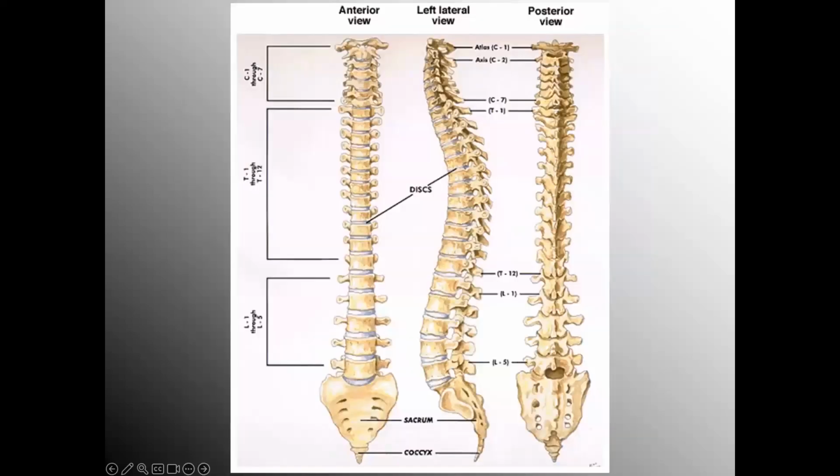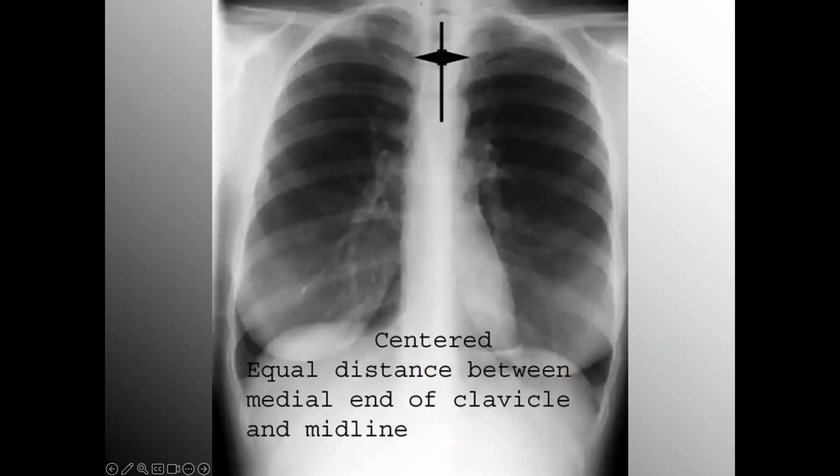Note that the thoracic spine begins, of course, with vertebra number 1, T1, but T1 also happens to have the widest transverse process of all the vertebral bodies in the thoracic spine. So what I'm trying to say, this is a great landmark to indicate where the thorax actually begins. It happens to be the widest transverse processes of the thoracic spine at T1. Very easy to find, and we're going to practice that coming up.